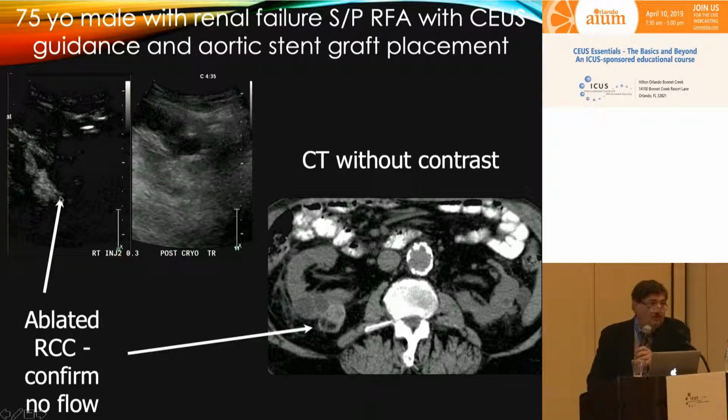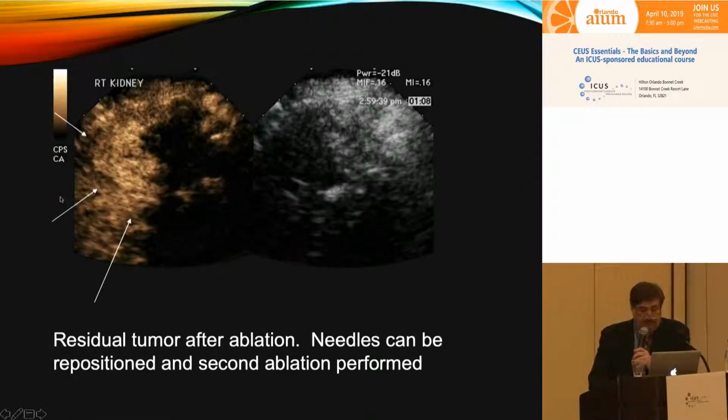So there's absolutely no one bubble in that area, so then we know that we did a complete ablation. This is just an example showing you a larger tumor that I ablated one portion, but you can see the increased enhancement here of the residual tumor that was not ablated.